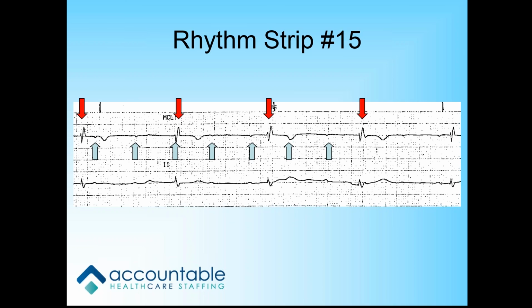Right. So it's regular, but these guys don't look like they're talking to each other, do they? No. What block are you in? Second degree? Third degree. Third degree heart block. Why did you say second degree? Because I kind of felt that they were working with each other at times, but not completely disjoined. But I guess they are disjoined when they aren't there. Right. Exactly. And this is your third degree heart block, and you would pace this patient.